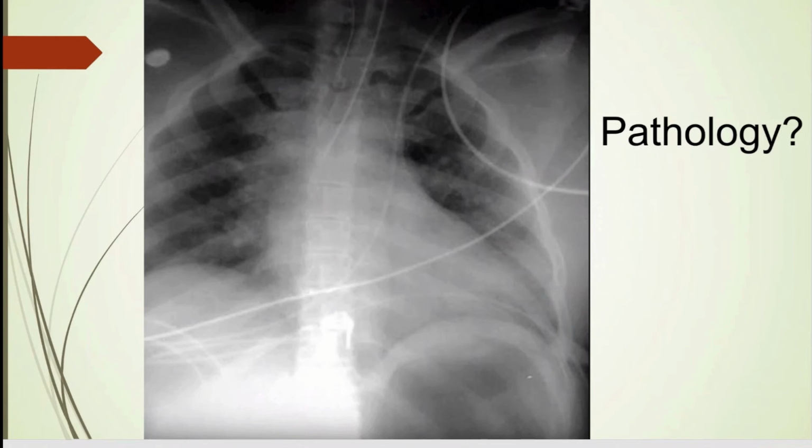So on to the next. So this one is interesting. I wish that it wasn't cut off, but we could see the whole thing, but still you get to see the parts you really need to. Just kind of a crappy chest x-ray. So let's start with A for airway. You can see the trachea coming down here, although it looks like it's a little shifted. Can't really see the carina. Just difficult to see. So that's airway, but we see something next to the airway here.